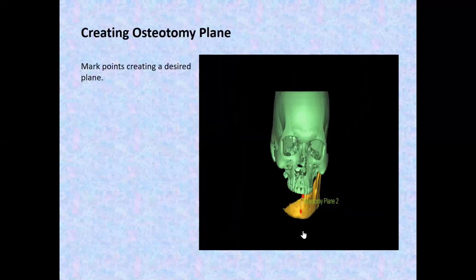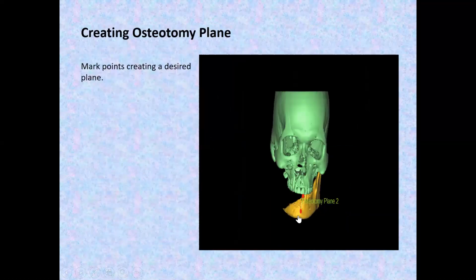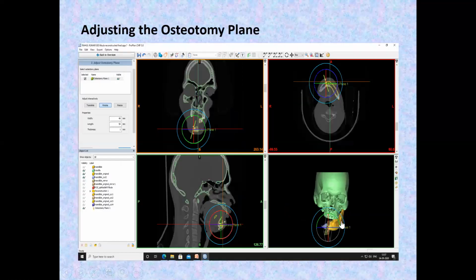If I can show, yes. Like I have selected these 2 points. I hope you can see I've turned them into red points. They will be green in the software, and then I'll click 1 point over here. You have to double click when you have to complete the plane. So when I double click on the third point, like somewhere here, the plane will be created.